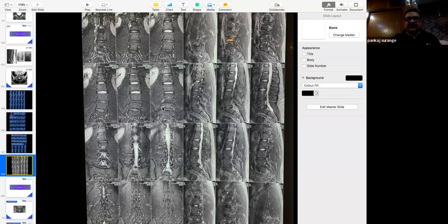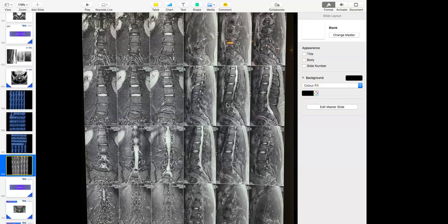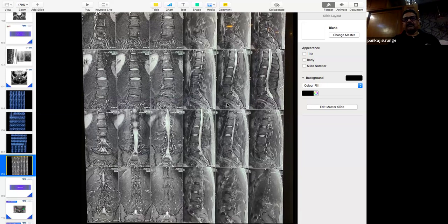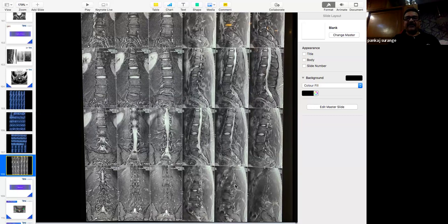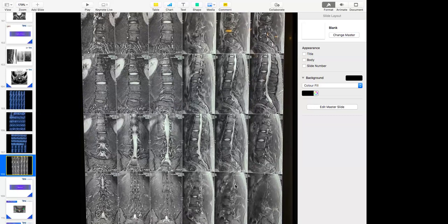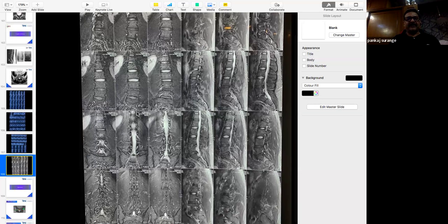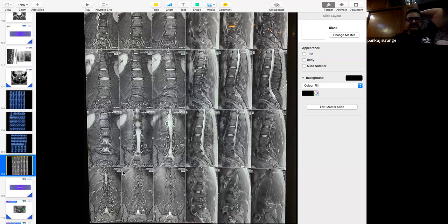This side is the coronal section. This side is the sagittal section. Sagittal and coronal, yes. Okay. What else is there? T1 or T2? First tell me. T1 or T2? T2, sir. Very good. You can see the CSF, so it is T2, right? What else is there? STIR section. Very good. So it's a fat suppressed image. That's why you can see all the fat has become darker. Bones have become darker. Whatever fatty marrow was there, it has become darker now. Okay? Understood? Yes, sir.